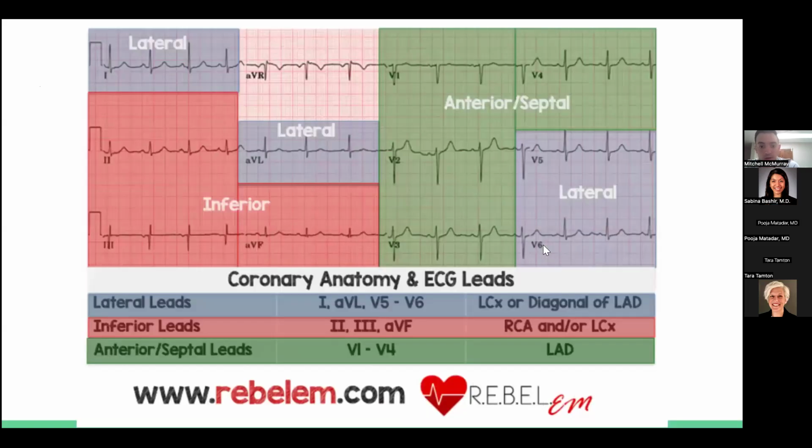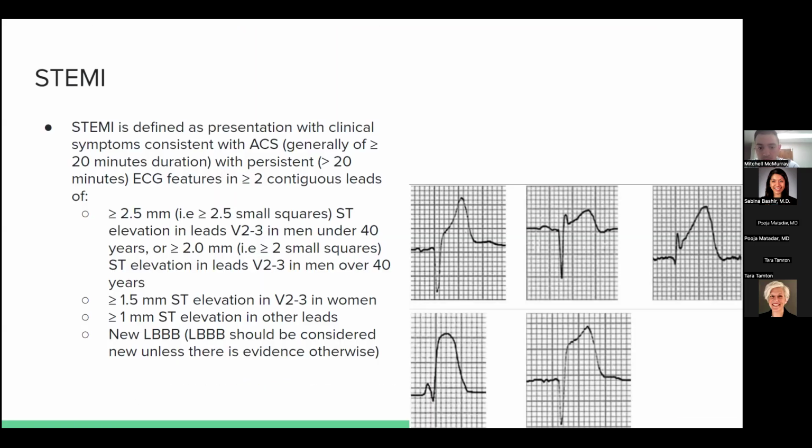So you just measure at the start of it, right? Not at the peak of it. You count up, just directly up. Is that what you mean? Okay, yeah.